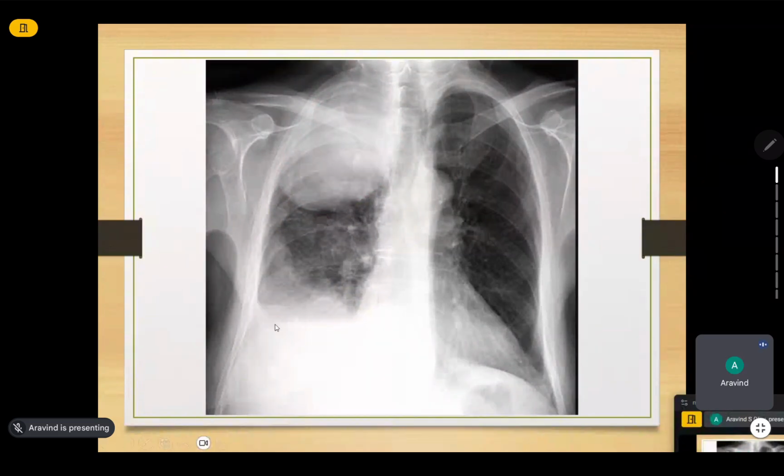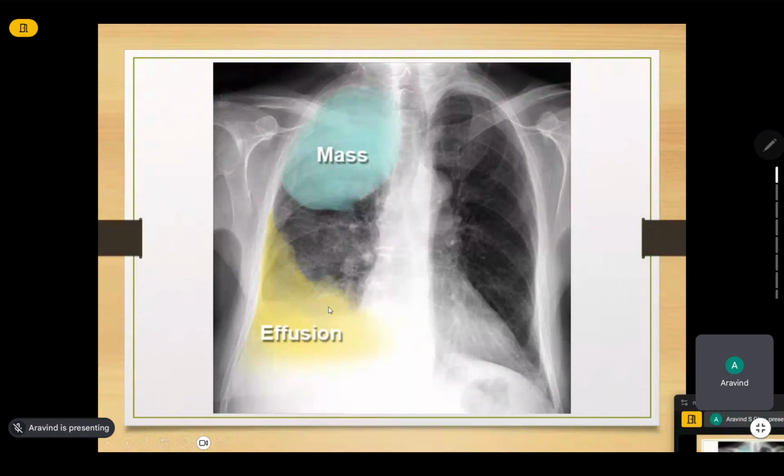And the patient is also having effusion here because the costophrenic angle is blunt. So there is also a meniscal sign here. The patient is having effusion. It is the meniscal sign. Trachea is shifted, no, sir? Yes, exactly. Trachea is also shifted to the opposite side.